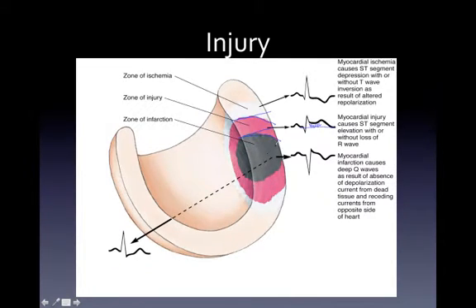So if we have a zone of injury, and this is highly ischemic tissue, this is almost ready to infarct, what it patterns on the EKG is it gives us ST segment elevation. And again, if we were looking at V3 and we saw ST segment elevation there, whatever zone is associated to V3, that's where we would say that the injury pattern is.